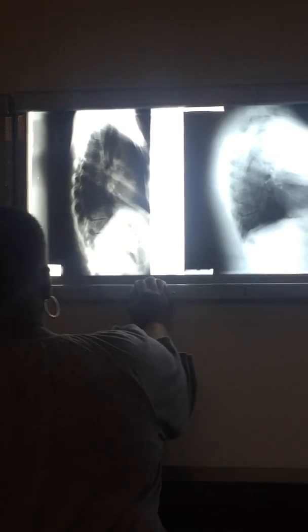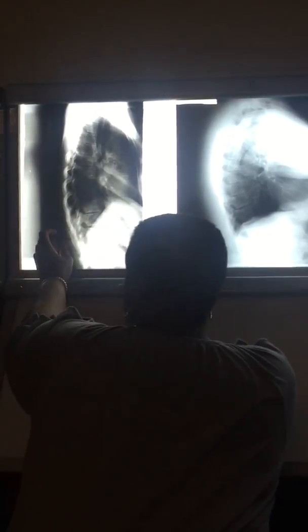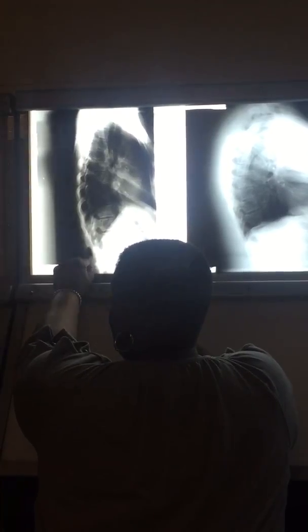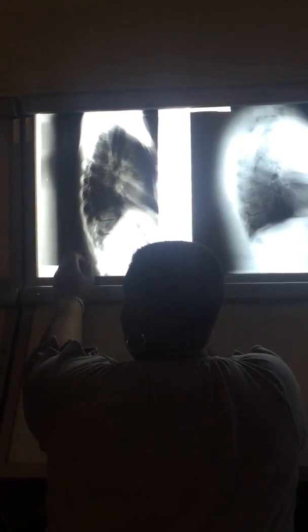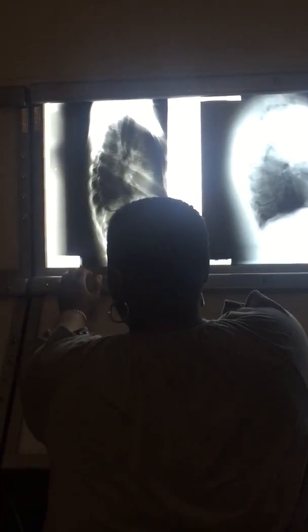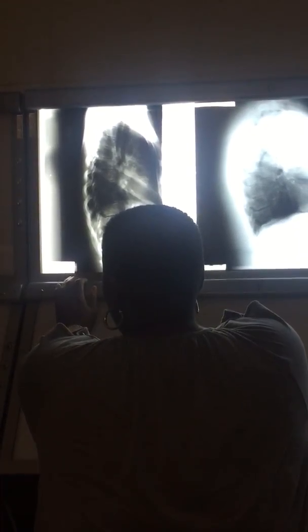You can check the ribs because there is no ribs going over. You see these little 2 ribs here, that's 12 there. And then there's no ribs going there. None there, none there. So you can look at the spinous process, look at the different sizes. 12 is going to be skinny. Then the next thicker one, that's going to be your L1. Then they start to get bigger as they go down. So that'd be one way that you can check to see which vertebra.